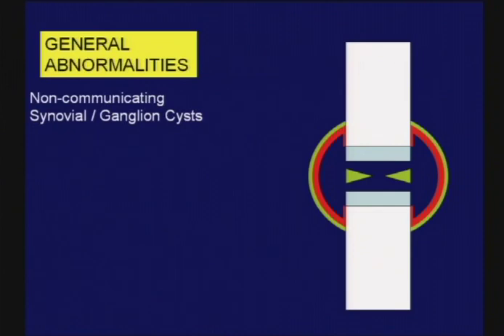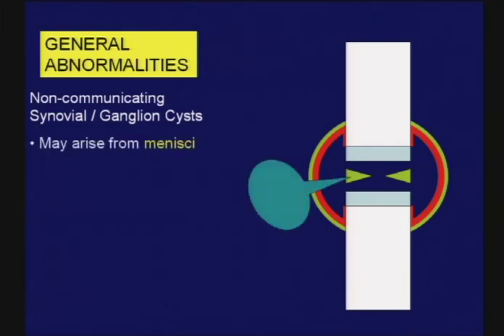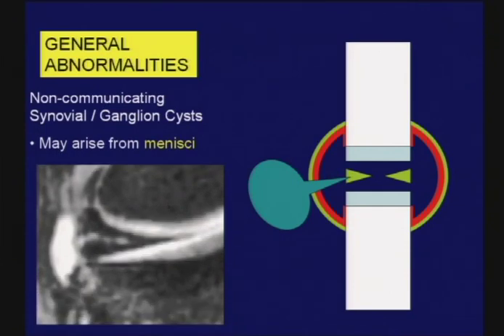With MR imaging has come the ability to recognize fluid collections. This has led to difficulty applying names to them. We use terms like synovial cyst, ganglion cyst, meniscal cyst, perilabral cyst. Differentiation among the pattern of the cysts is probably best left to a pathologist and not to a radiologist.